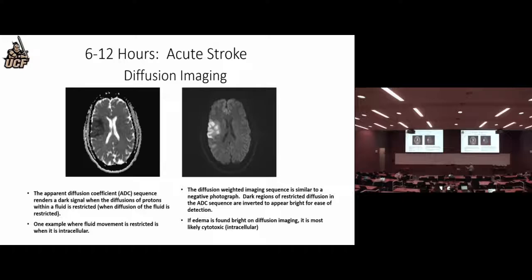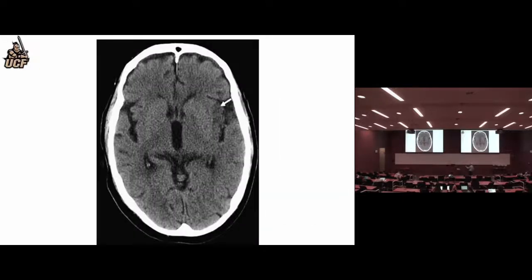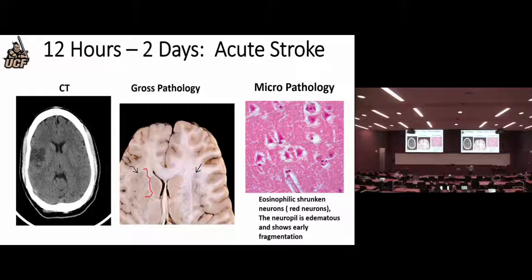And then you go over to here. If you had to distinguish, these look much more shrunken down and contracted, don't they? And look, this white area is much larger in comparison. This looks like something that used to fill this whole space better, and now it's sort of shrunken down. To me, to tell the classic red neuron, it's more that it's shrunken rather than it's red, because you get the red really from the dye.